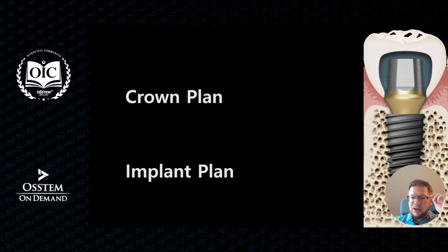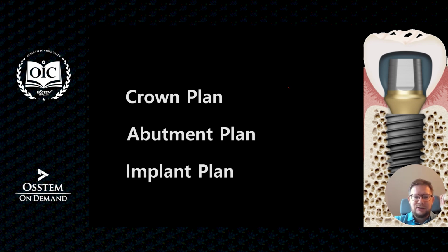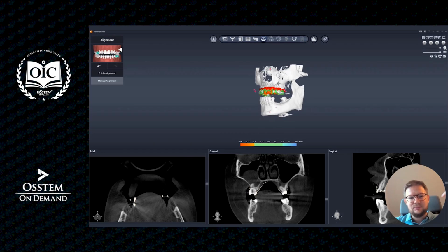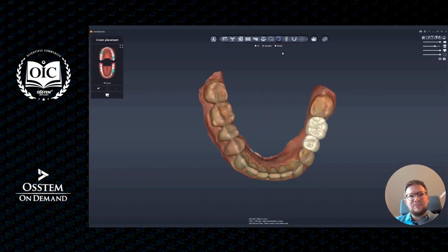So what I want to say right now is that backward planning today should be done from the crown, of course, but through abutment to the implant. And if we secure the optimal shape of that abutment, we will design the tissue at the healing process or the time period after the implantation. So the planning right now we can do like that.